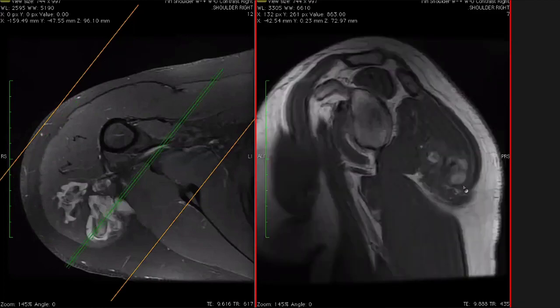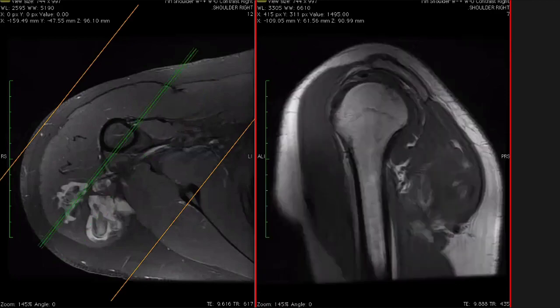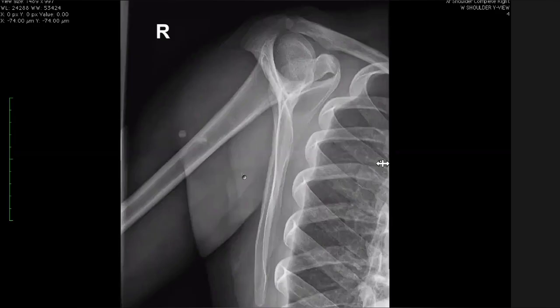All right, okay. So let me show you the X-ray again so that you remember: whenever you see any round calcification in soft tissue, you think about granulomas, foreign bodies, cysticercosis and all those things. But don't forget that round bodies can be phleboliths. And I was very pleased that on the first image, you said it is not in the joint, because the joint will finish here. That should be the capsular attachment, so it's distal to that.